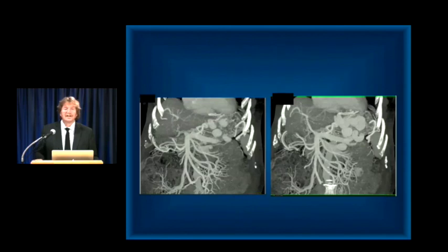lower esophagus, and the spread of varices in the collateral pathways are particularly nicely seen in the same case on these MIP images. Remember, MIP is a projection technique. I mentioned in other talks about MIP when there's lots of collateral vessels, be it pancreatic cancer with vessel encasement, you really get a feel of the extent of the collateral pathways.